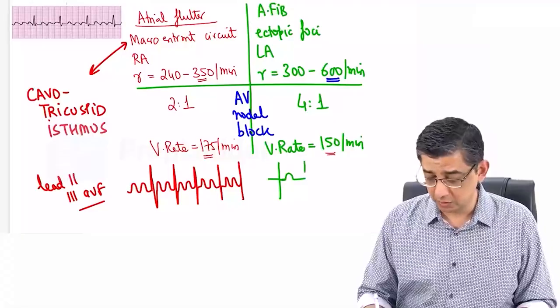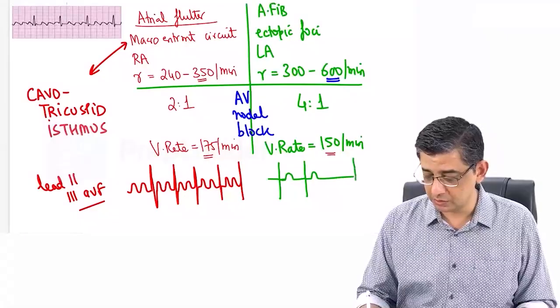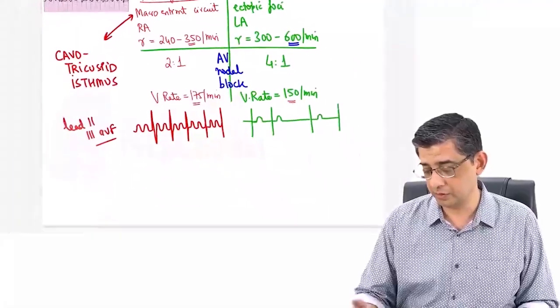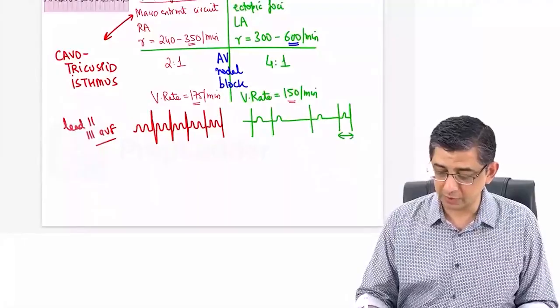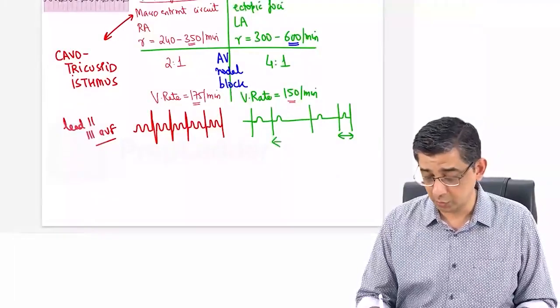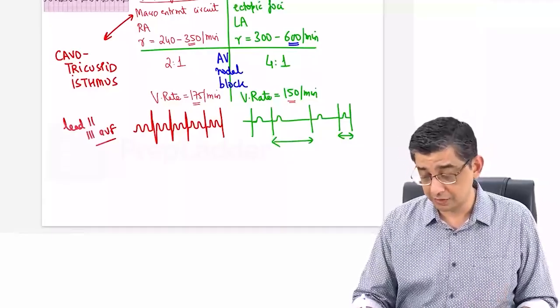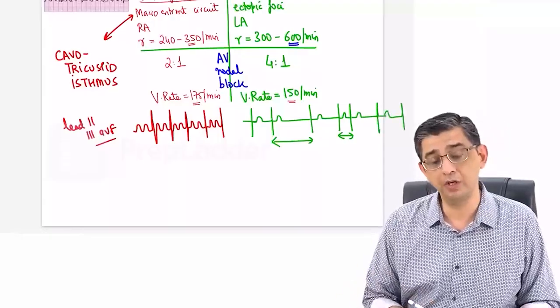I just try to symbolically show that what is most predominantly present in all ECGs is the irregular heart rate of the patient. You can notice the huge difference. The heart rate has suddenly jumped up fast, then has become normal. I did not say slower, I said it has become normal. So this kind of arrhythmia where heart rate can touch normal is present only with respect to atrial fibrillation.